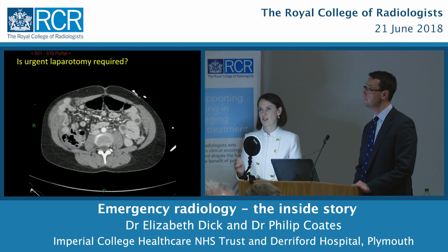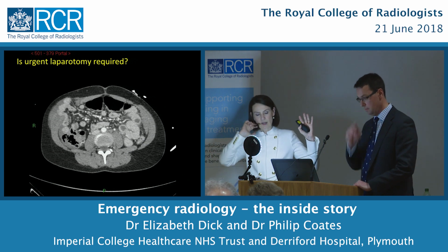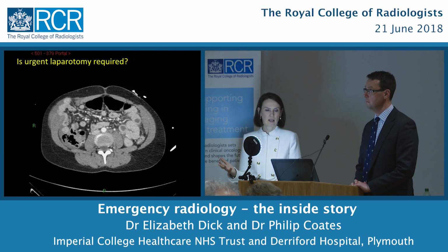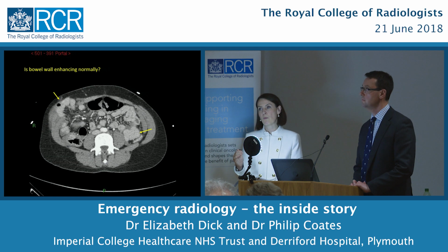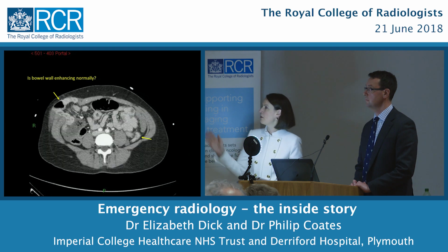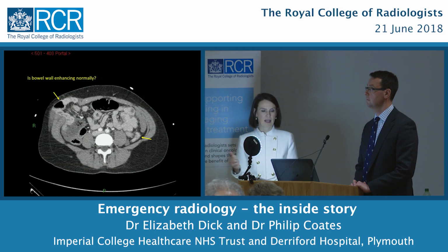And the first thing the surgeon asks me, because the surgeons are all standing behind us, kind of asking lots of questions and breathing down our necks, is do we need to do a laparotomy? So the question is really, is the bowel healthy or not? And the way we assess that is the same old principle. We look at the bowel wall and whether or not it's taking up the iodine contrast. So I compare it to some normal looking bowel, for example, over on this side. Let's compare to this bowel. And this bit is enhancing normally, so that's okay.